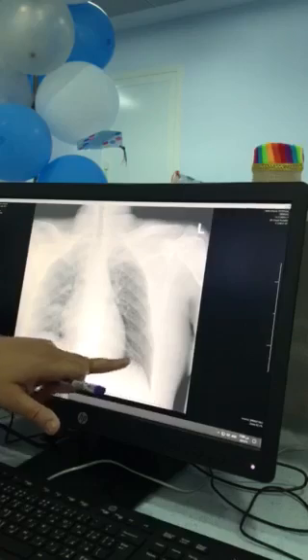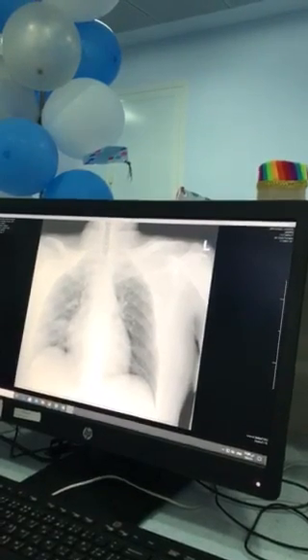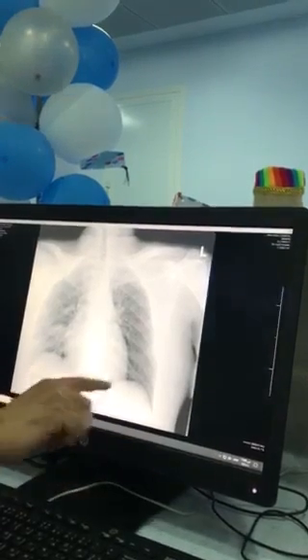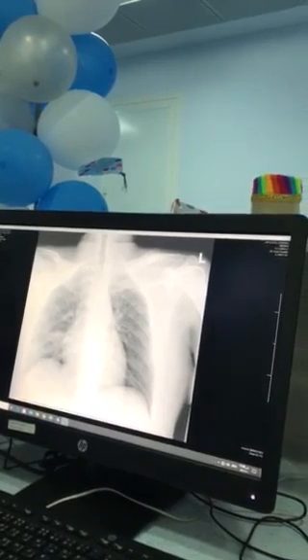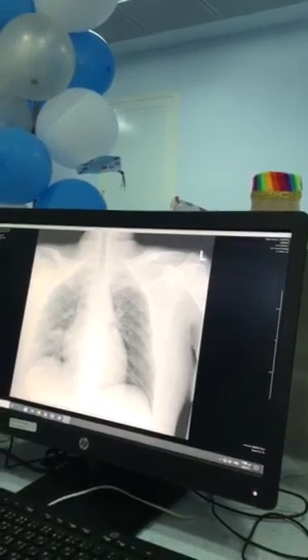Okay, you will see this diaphragm, whether it's flat or domed. Okay, if the patient has a lot of inspiration, this will be flat. That will be domed like this. Okay, so ideally the X-ray should be taken with deep inspiration as sitting, but because you have here more sick patients, that's why we'll do portables.